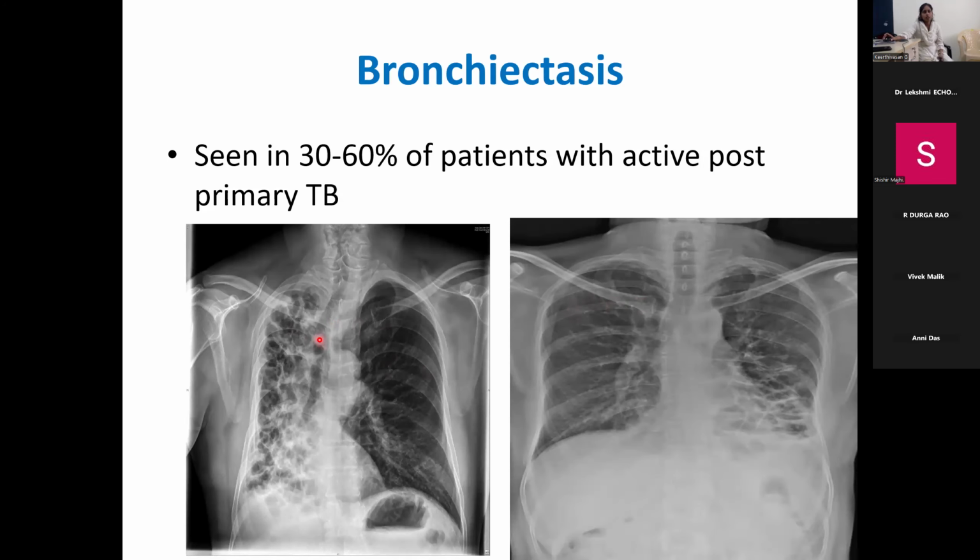The next is bronchiectasis. So you can see these ring-like shadows, cystic shadows, completely from top to bottom. The entire lung on the right side is involved, and it has undergone fibrosis. This is compensatory hyperinflation. Here, which lobes are affected? Mostly you can say the lower lobes and the lingula if you take a CT.